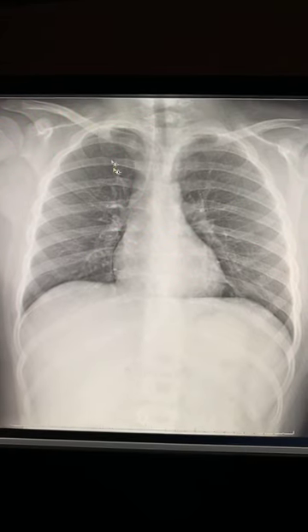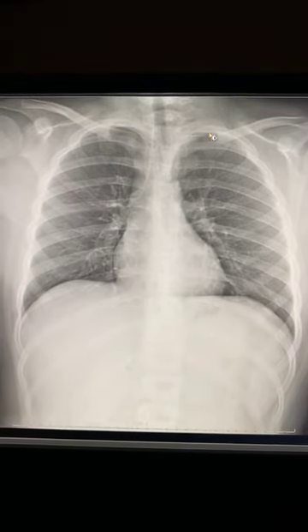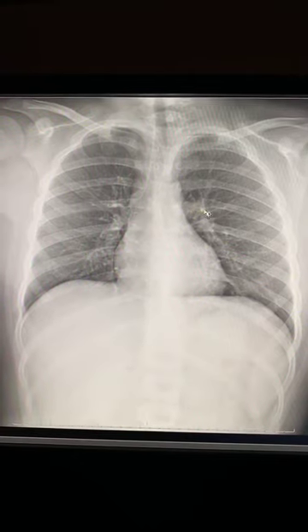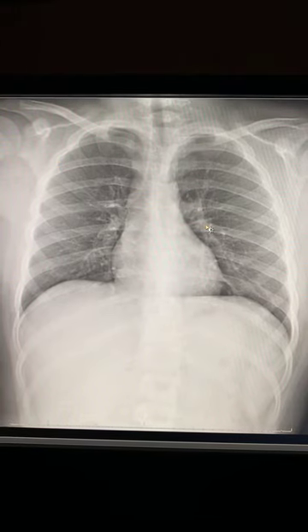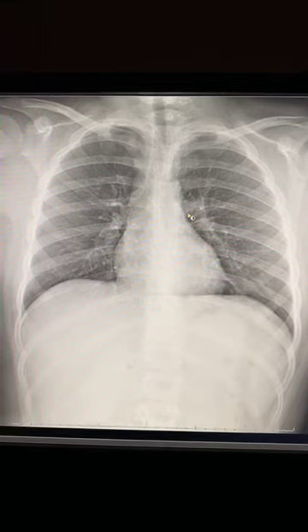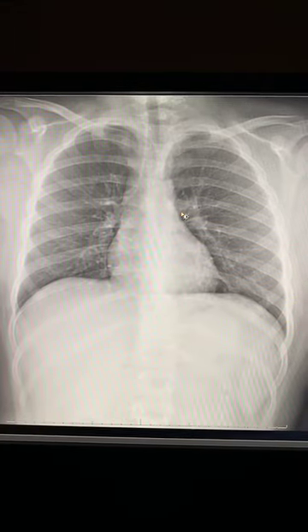So if I'm looking for a pneumothorax, not always will you see a pneumothorax up here. That's if it's upright and the air rises, right? Sometimes on your ICU patients, you won't have the pneumothorax up there. You'll actually see the pneumothorax kind of anterior. Imagine somebody's laying down, the air is going to rise, so it's going to go up towards the top of the chest cavity. So that's harder to find. That's harder to diagnose.